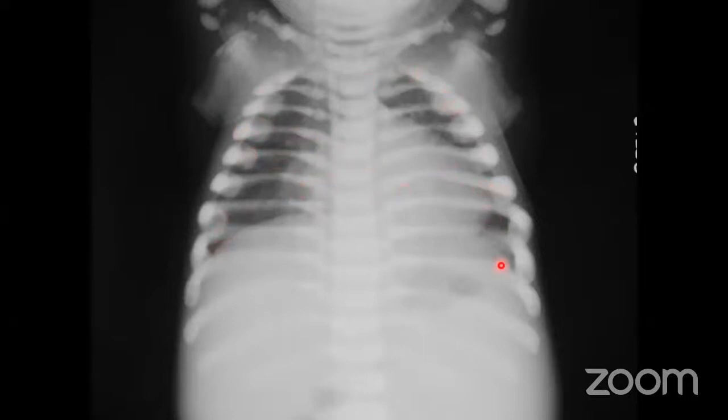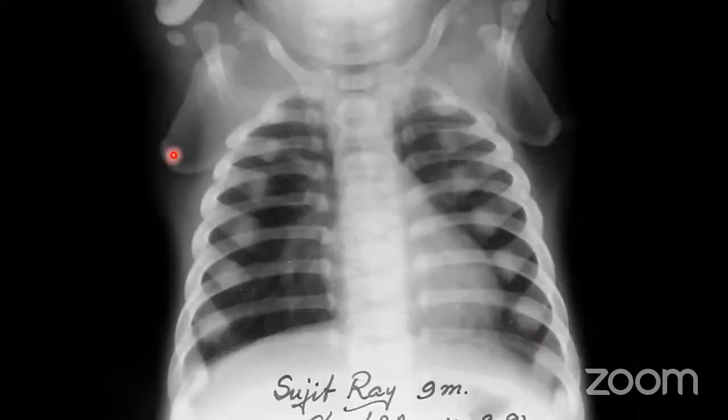So this is a case of osteopetrosis or marble bone disease, as the marrow is being replaced by sclerosed bone. So there will be less marrow to form blood, and the child usually suffers from anemia, and that's why the cardiac silhouette gets enlarged.